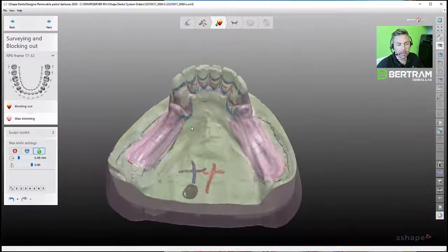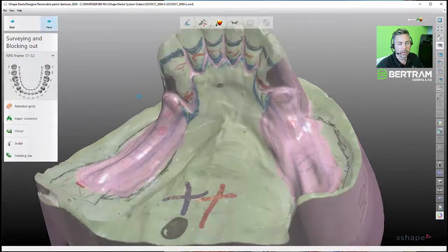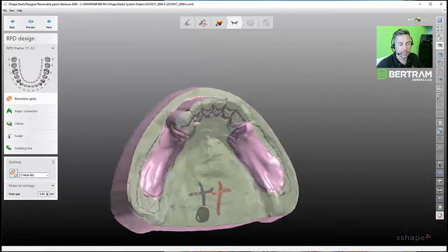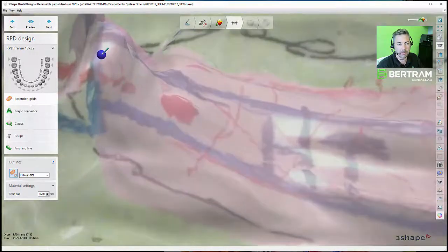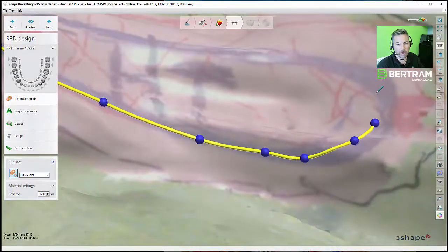All right, so we have all the blockout how we'd want it, and we're going to move on next to our resin gaps. We need to make this 0.8, and just our regular mesh that we always use, this first part. I'm going to fade this wax out a little bit and get these laid down, and then we'll pick back up in a minute.